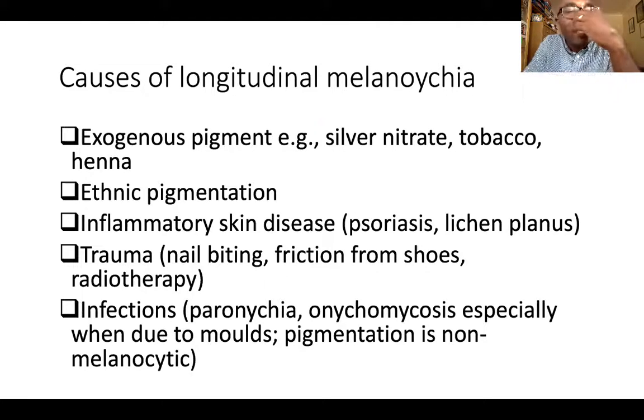Particular infections is Pseudomonas. So I saw a patient some time ago in two-week clinic who had this green pigment tinge underneath the nail bed, and it had been referred as suspected melanoma. Obviously, on history, you realize that he's a keen gardener, and therefore he's been digging and rarely uses any gloves, and he's going to develop some Pseudomonas, which has this greenish appearance in the nail.